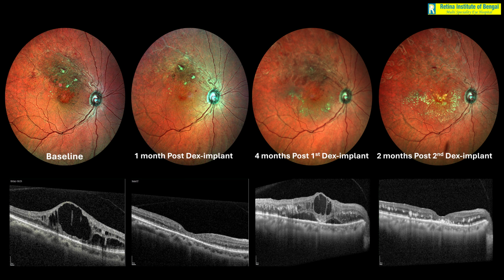You can look at this greenish patch which tells us that in this area the retina is thickened. That means there is edema. It also tells us how large the area of edema is. Just by looking at this, you can make out that our entire area is edematous. And you can see on this OCT gross cystic changes. There is also loss of these central columns, which tells us that this is a really chronic case and visual recovery may be a little less than we would have desired.